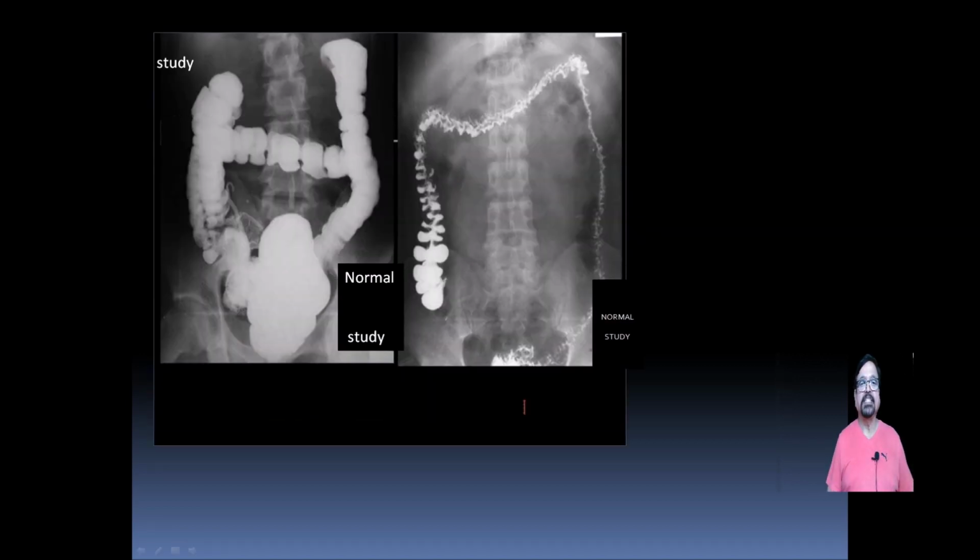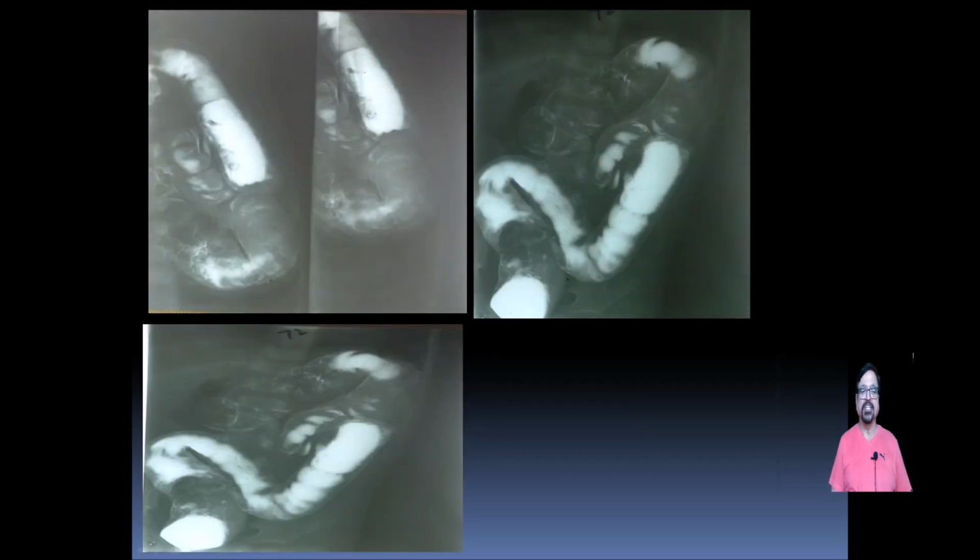Now, from here we'll be seeing actual cases. Most of the cases, certain pathologies are covered, but we do not say we have covered all the pathologies. We have different series of the examination where different pathologies are shown. There is also a series which only concentrates on the role of barium as a contrast medium, and in this we are talking again about barium enema. So there is some overlapping between the two lectures.